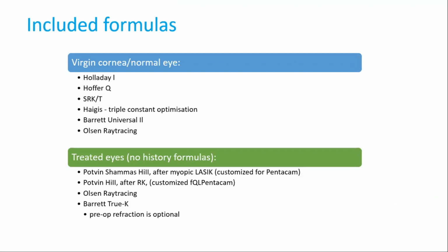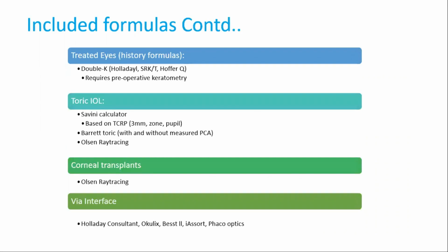And there is also a feature for scleral contact lens fitting. There is a wide variety of formulas available in Pentacam AXL. These are the formulas which are available.